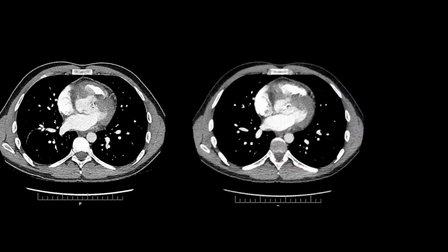Unfortunately, there were no cardiac CTs, but there was just a general CT that was done at the time. It's hard maybe to see from these types of windows. It's the best I could get from a chest window. But essentially here, you have your mass with contained rupture, and there's actually hematoma here. There's hematoma, abscess, and contained rupture here.